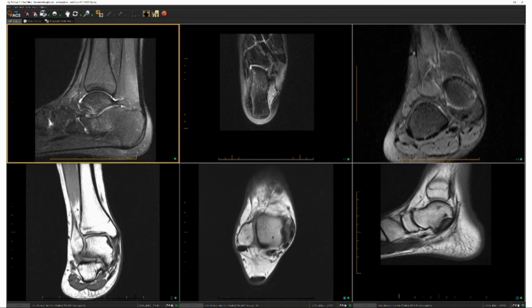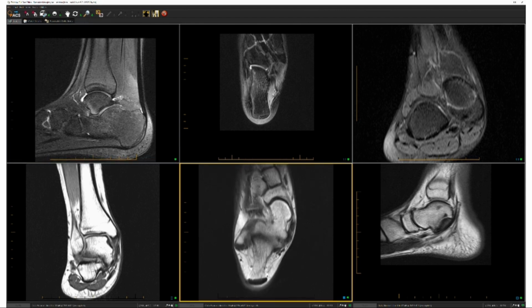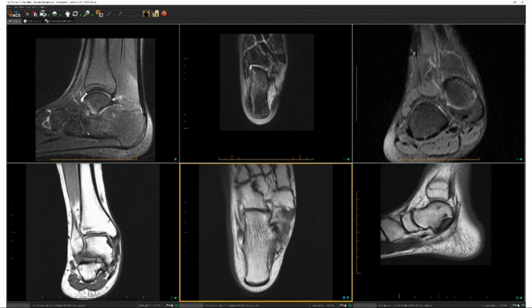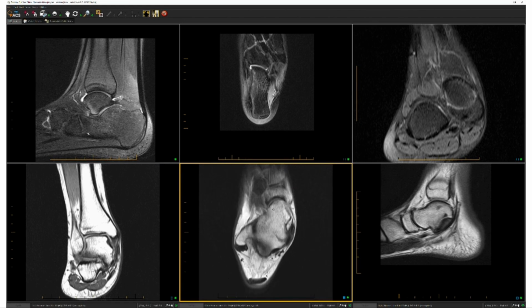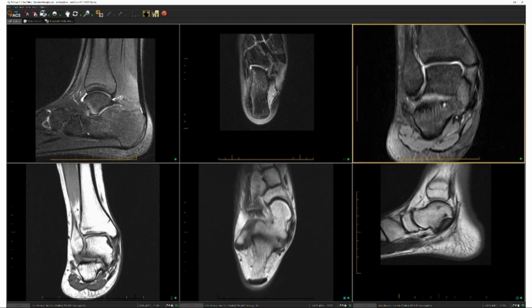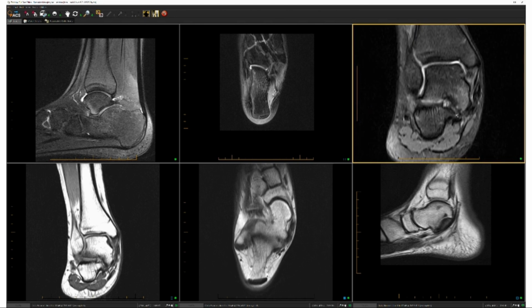And one of the things we noticed was that the lateral talar process has edema, and that can be seen in hindfoot lateral impingement. So lateral impingement, when the lateral process of the talus tunnels into the angle of Gissane, is something that can be seen with overloading hyperpronation biomechanics. And that's what would typically occur if we do have a coalition in this location medially, inferiorly.